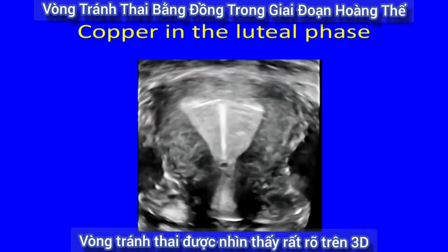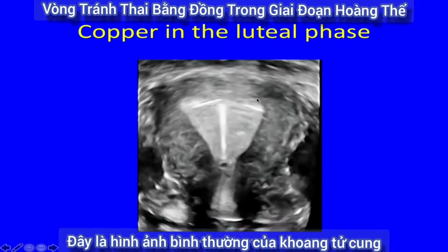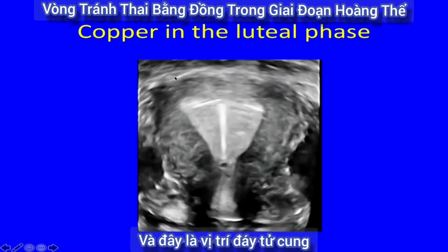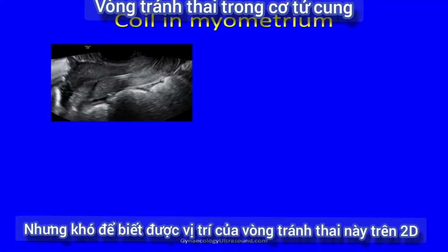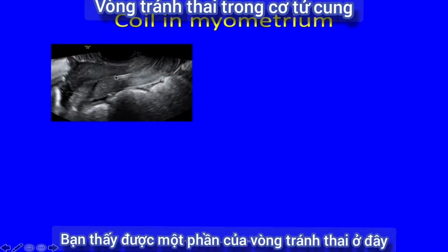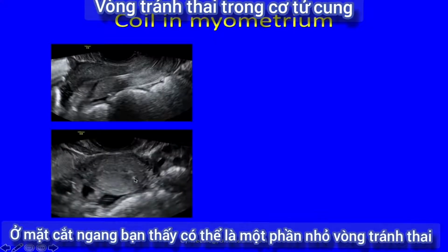Coils show up beautifully on 3D ultrasound. So here is a copper coil in the luteal phase endometrium. This is a normal shaped cavity, so the uterine fundus is there. But this coil was harder to know where it was on 2D. You can see a bit of coil there, you can see a shadow there in 2D. In the transverse plane you can see a little bit of possible coil there.